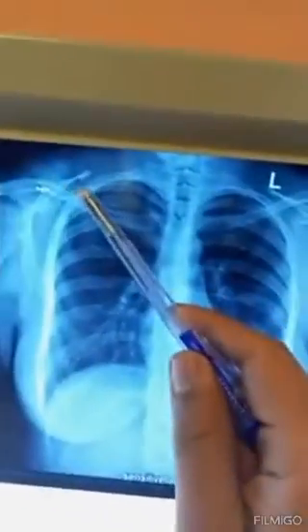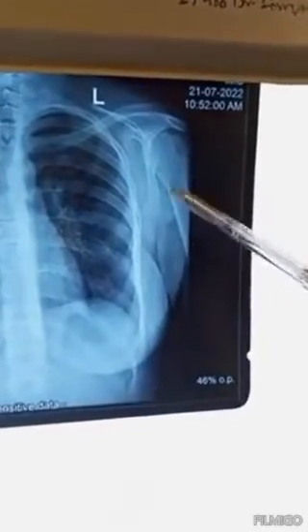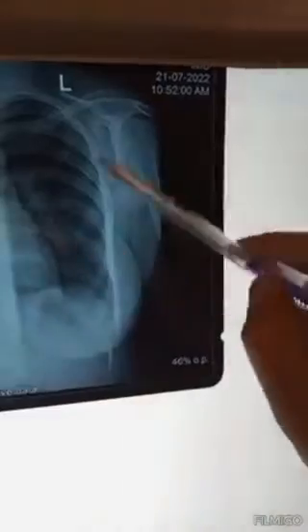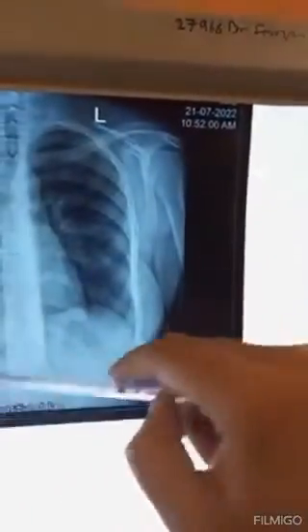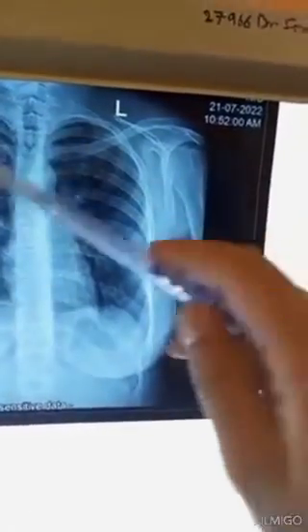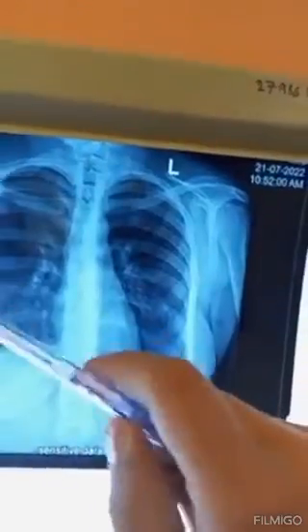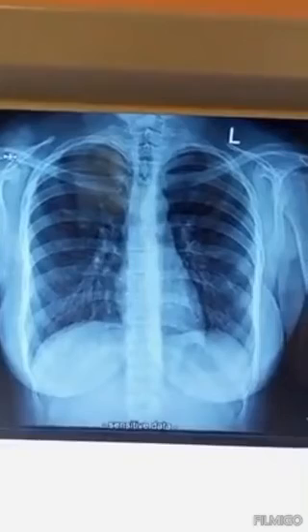You can see the clavicles normal looking, the head of the humerus, so these are also looking normal. And then the scapula with the axillary fatty tissues, etc., and the breast, right? So these are everything else: bones, humerus, ribs, vertebra, cervical vertebrae, etc. You can comment on everything else. Remember RIPE and ABCDE.